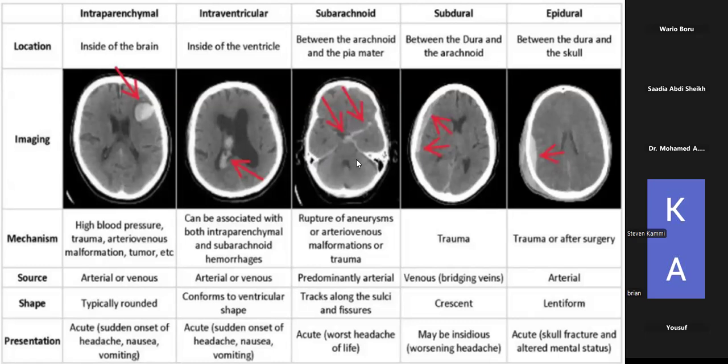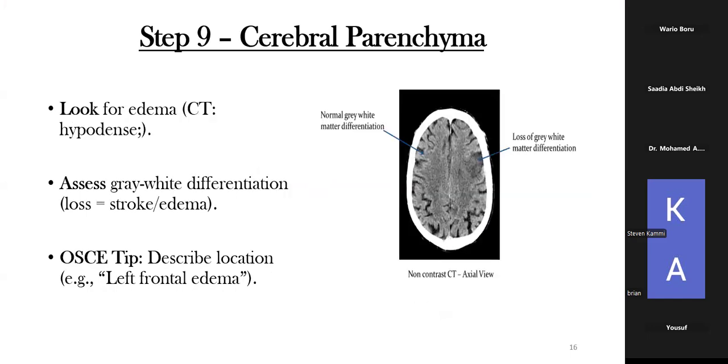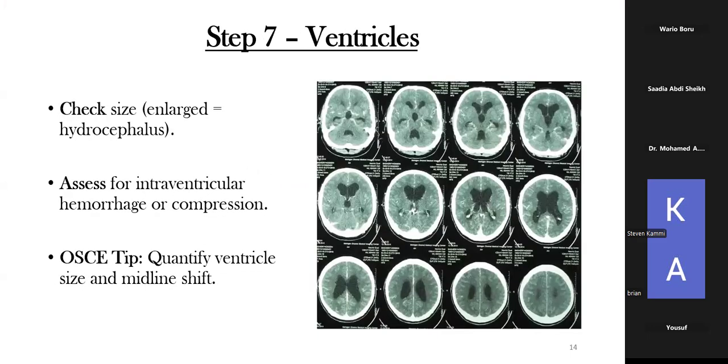Next we go to, please recap on the different ventricles. So different ventricles, let me see if I have this one. I can use this one. So here, these are axial cuts. In axial cuts, you start from up here. These are your lateral ventricles that are starting to be visible. So lateral ventricles all the way. Then in the lateral ventricle, you start to see the third ventricle. This is the third. Remember the third normally is going to be slit shaped. Then as you go much lower from the third, you start seeing what should probably be part of the aqueduct. Then here you have the fourth ventricle. Remember the fourth ventricle is in the posterior cranial fossa. So fourth, third.